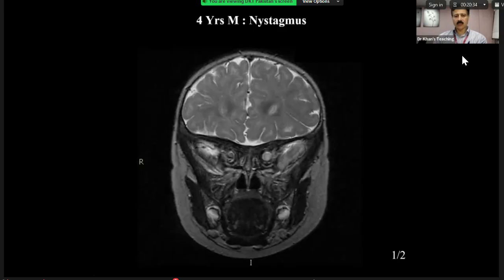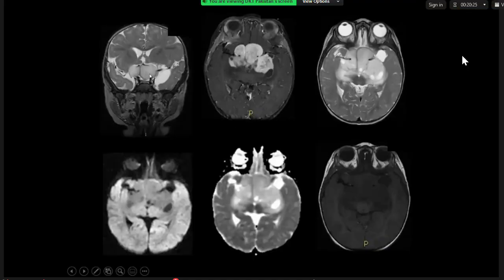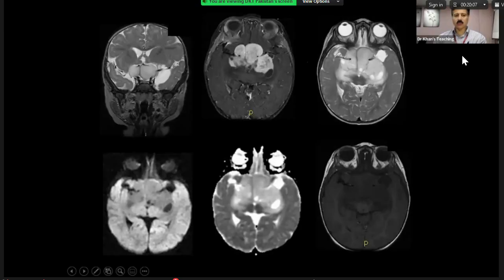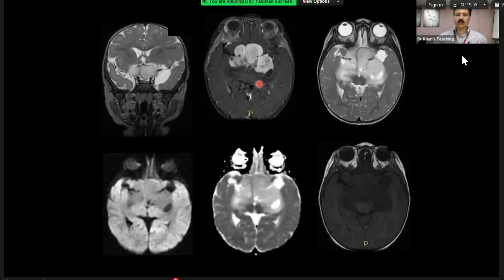Left optic, so just on this you have picked up this. Very good. Wow. Now what? So it's gone backwards. So anatomy wise, where are we sitting? It looks like the basilar, and so you've got the ICAs inferiorly. Yeah, very good. So the pituitary is here, so we are superior to the pituitary, right? So that means optic chiasma. Agree? Now, please remember, they are going to begin with axial.